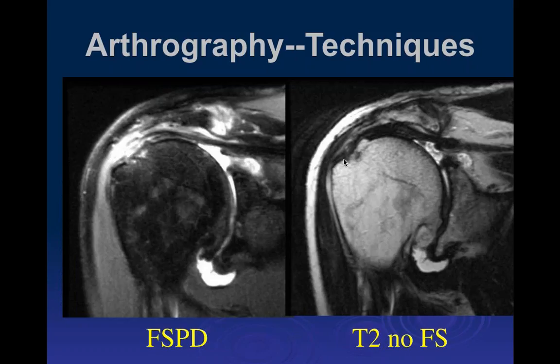And what you find here, this is an arthrogram, that we do have imbibition of the contrast in the area of the abnormality, but you don't have free flow of the contrast into the subacromial subdeltoid bursa. So one thing to remember, and we'll see variations of this, is that you can actually have a false negative arthrogram, because you can have a significant tear, but if you have scar tissue in the area of the tear, it won't freely communicate with the subacromial subdeltoid bursa. So in these more chronic tears, you have to be aware of that issue as well.